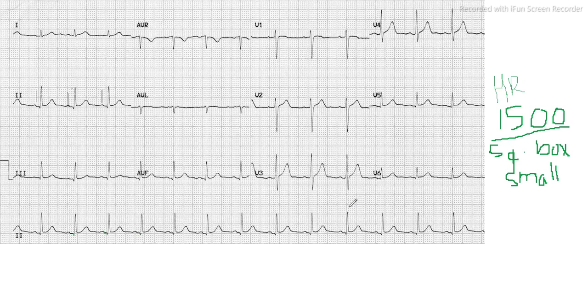Here this is one R wave, and this is the next R wave. You count the number of small square boxes: 1, 2, 3, up to 18. So there are 18 small square boxes between these R waves. When we divide 1500 by 18, this gives you your heart rate. This is one way to find the heart rate.